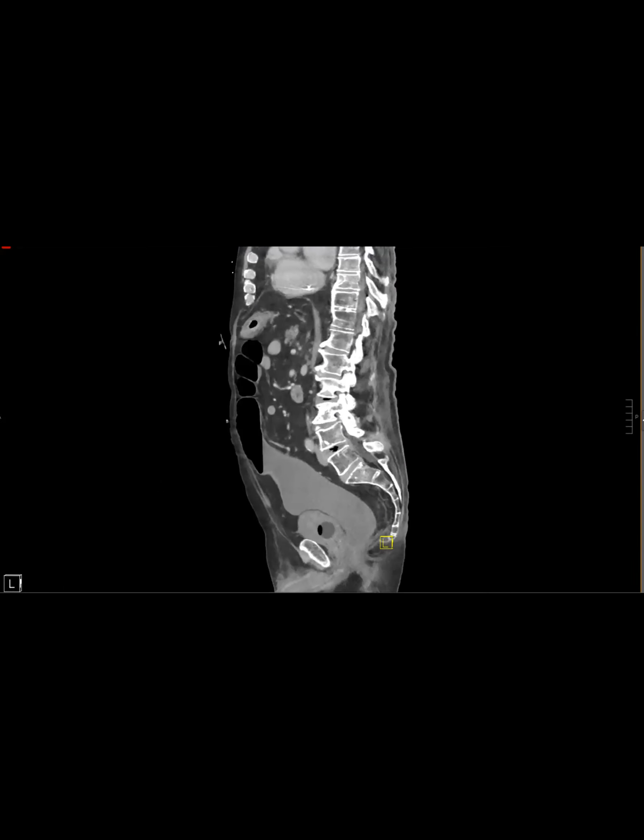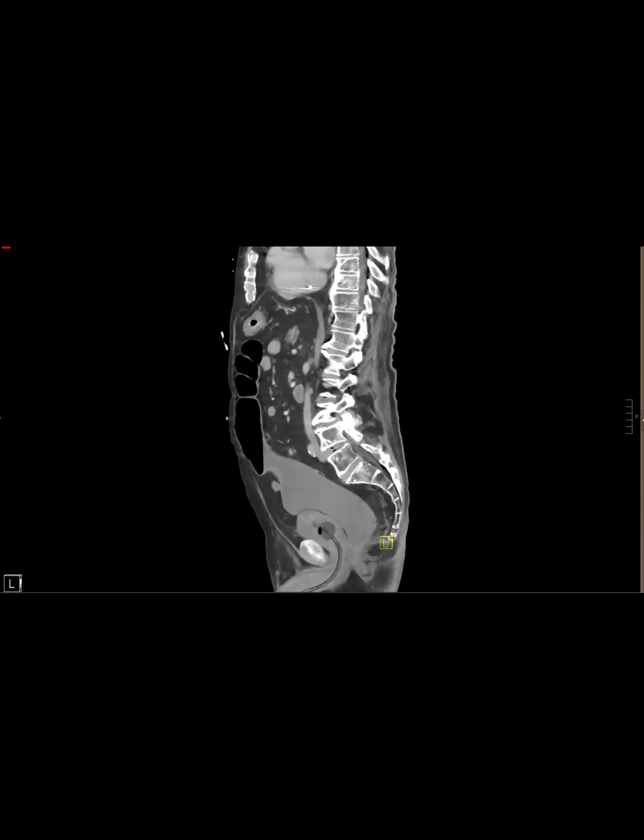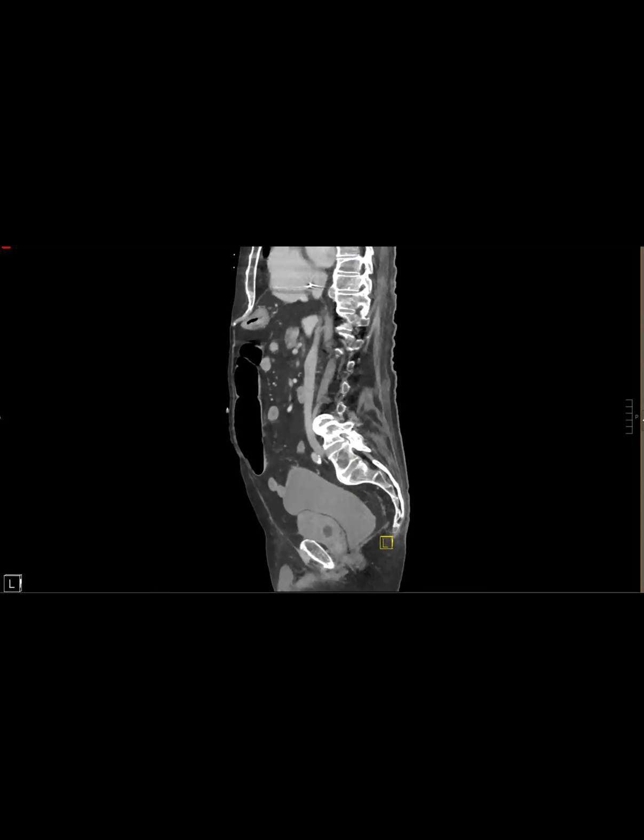No, that's true. I think they also had a cystoscopy, because it could be malignant. The patient does have a history of C. diff and it's recovering. So that may explain some of the colonic findings that we're seeing.